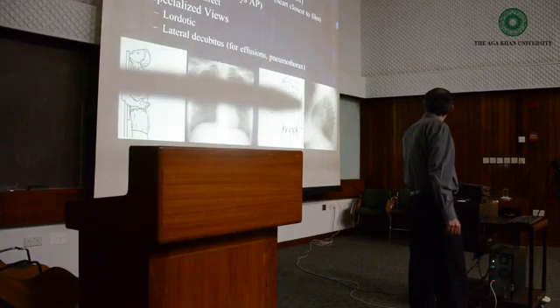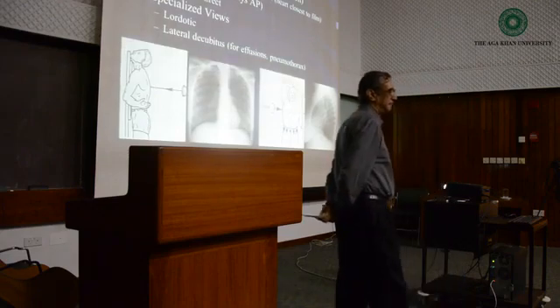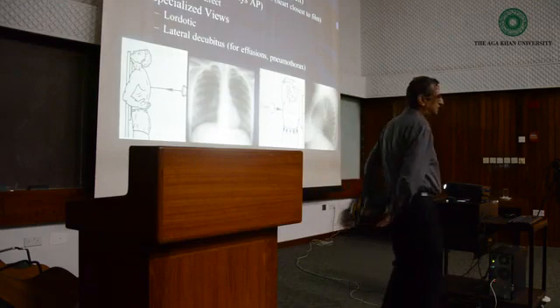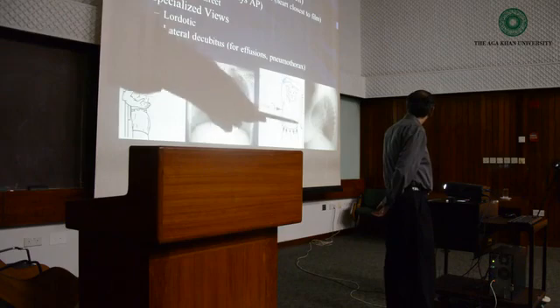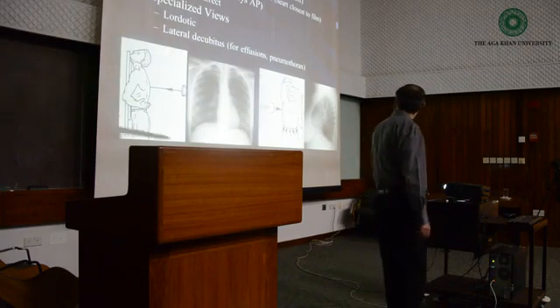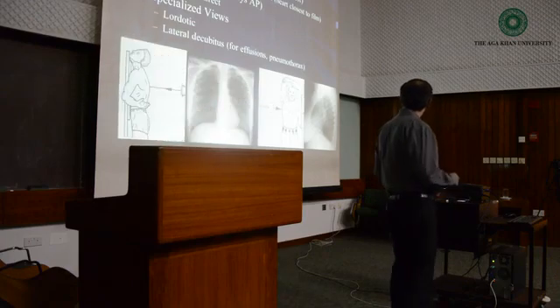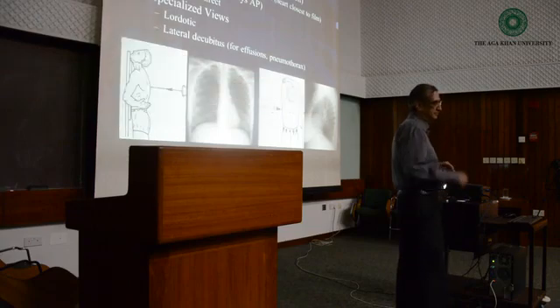And this is a lateral view. Is it a right or a left lateral? No, which part is touching the image? So this part decides. So if the left of the body is near the image plate, it's a left lateral. And for a right lateral, you would have to place the film here. So that's how a lateral view appears here.